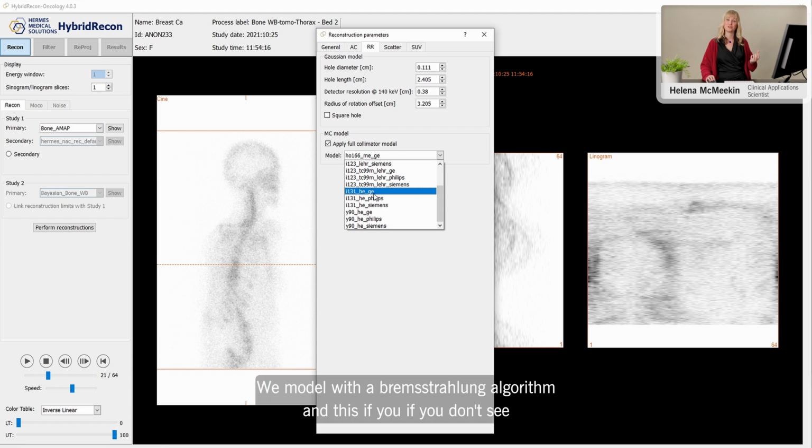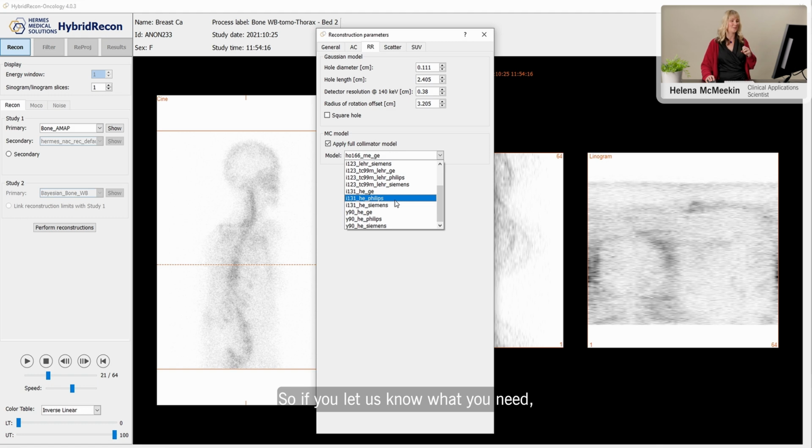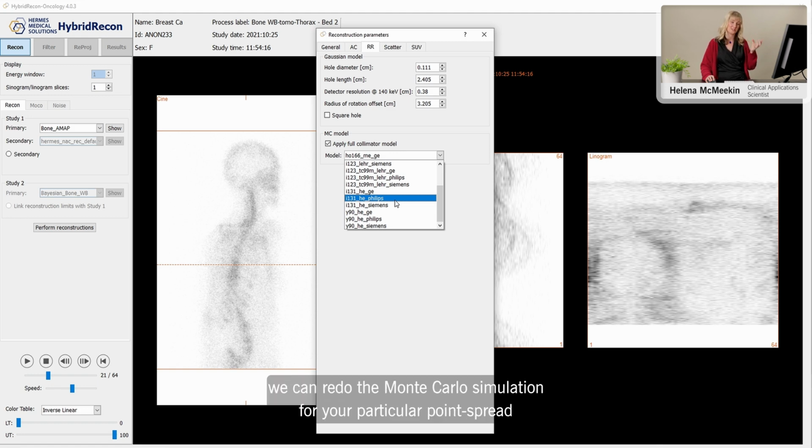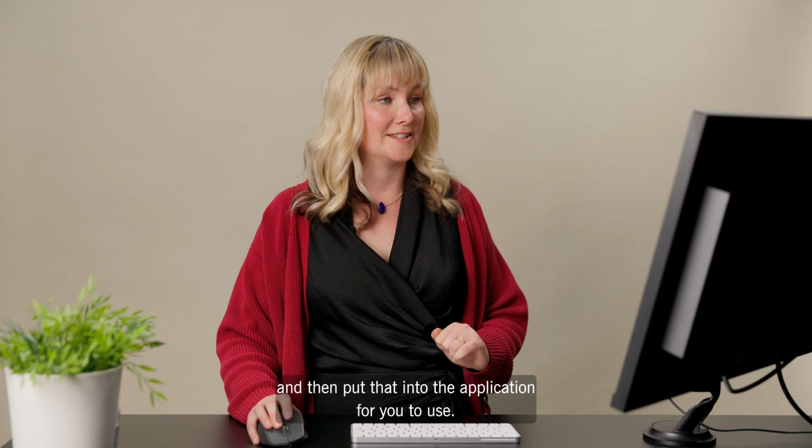We model with a Bremsstrahlung algorithm. And if you don't see your collimator and scanner selection here, we can also make this for you. So if you let us know what you need, we can redo the Monte Carlo simulation for your particular point spread function that you're going to be seeing, and then put that into the application for you to use. This application performs Monte Carlo scatter correction.